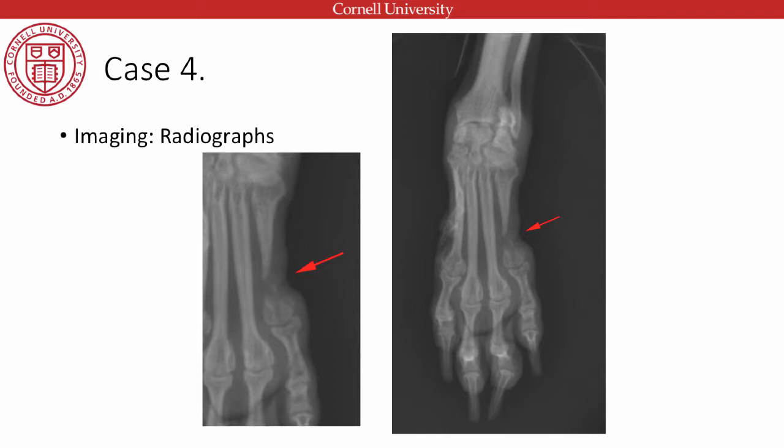So I would say this is weeks versus months. It all depends on the degree of constriction, because clearly it's been there and slowly constricted down over time. So I would say we're looking at the sort of 3-week range of chronic obstruction to get that degree of demineralization.